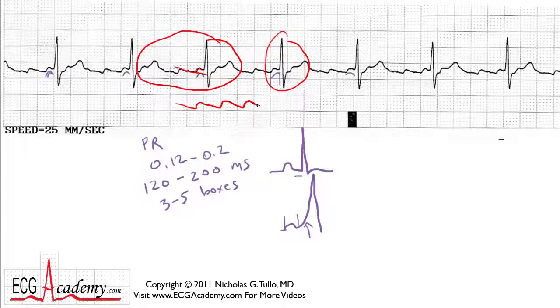What does a sawtooth wave tell you? Atrial flutter. Now, how do you know it's atrial flutter? Well, if you look really closely, behind this bump there's actually another bump that looks just like it, right there. And if I take out my teeny weeny calipers and bring them on over, you can see that, well, my marks got in the way of that one. Let's measure these over here. You have these two, which are a little bit slower than 300 beats per minute, probably about 275 beats per minute.